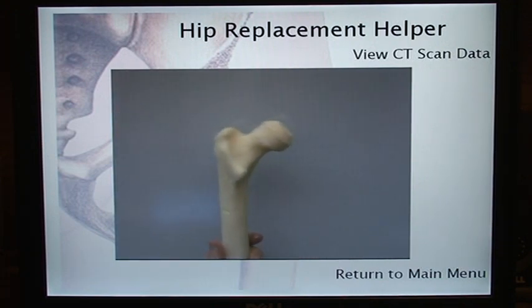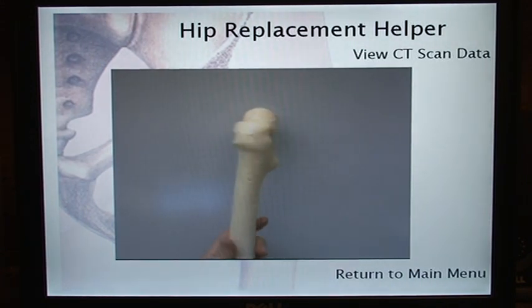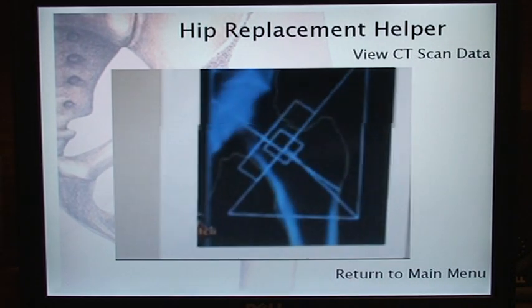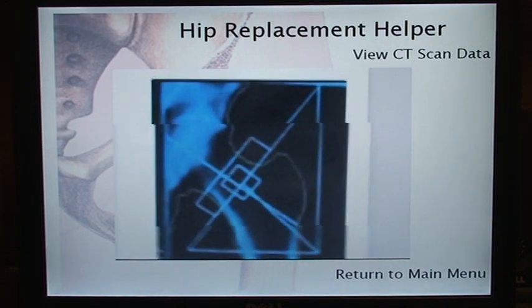With the optimal viewing angle selected, the physician can then select a software measuring function that will use the three-dimensional image to automatically calculate the optimal location of the pilot hole required by the ball stem device.